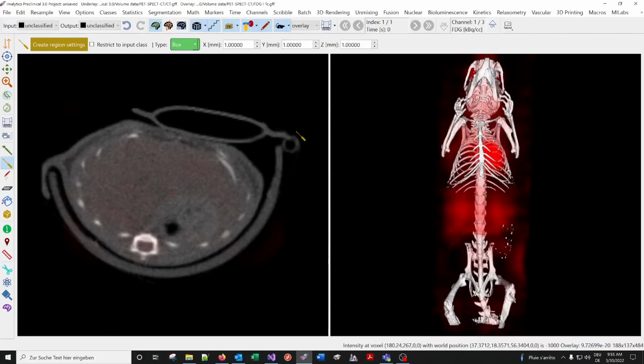Today I'll quickly show you how to use the Create Region mouse mode. Here it's this one. When you select it, you will see here a toolbar special to this mouse mode, where you can select different types of regions like a cylinder, a sphere or a box. And it allows you to place such simple regions anywhere in the segmentation.